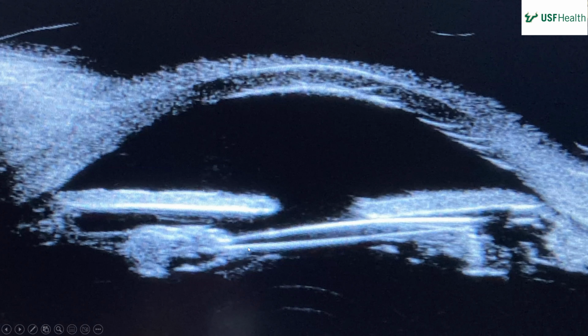You know, when people do cataract surgery, sometimes they just don't get everything. It drives me a little crazy because we have to go do an IOL exchange. So that's probably just old lens material there. But then anything about the IOL? Now, I don't see the orientations on here somewhere, but on the right is 12 o'clock and on the left is 6 o'clock. So this is a vertical UBM.